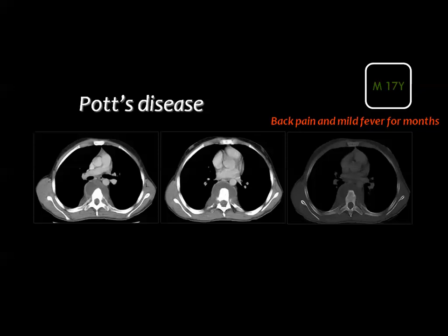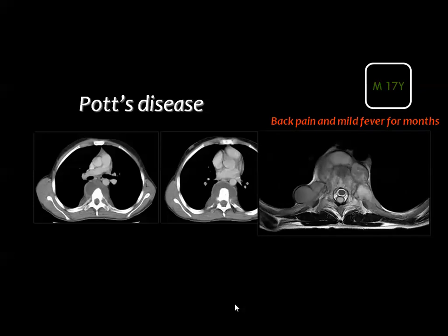Spinal lesions in the pediatric age that may present by mediastinal pathology are, in most of the cases, related to spinal infections by TB. And if you see vertebral erosions and involvement of the disc with prevertebral collection representing the cold abscess, this is tuberculous spondylitis.